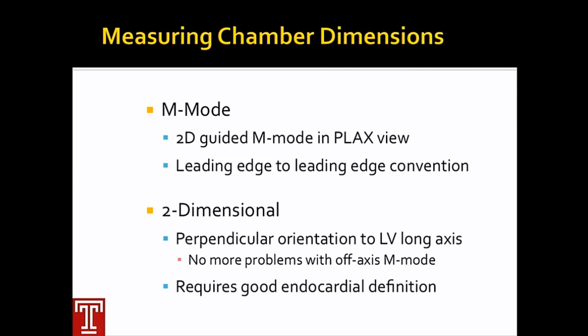Luckily, the thermal paper is gone, and I do think that some people wish that M-mode was gone as well. But M-mode is actually very helpful. It has great resolution and great time-space resolution. So we still make M-mode measurements, at least in many labs, including my own. So you need to be aware of M-mode.